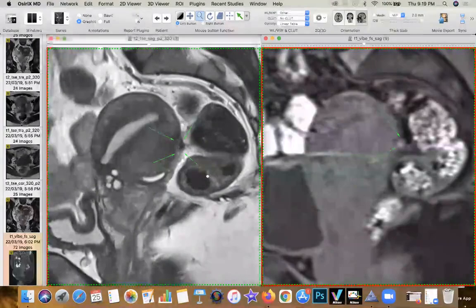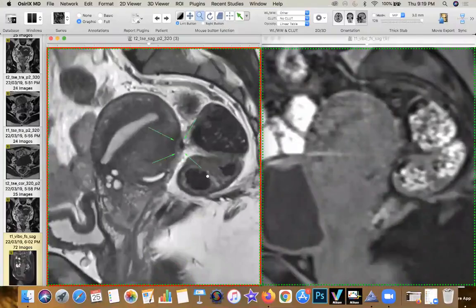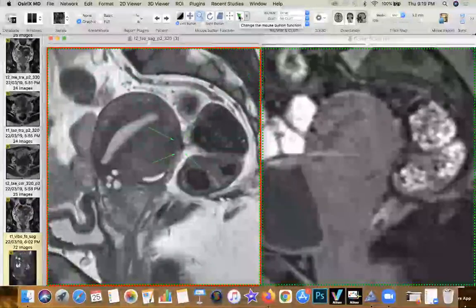Now let's see what's happening, first of all, to the corpus, and then what is happening to the surrounding structures. Now, these are important. I'm going to spend about 10 minutes on this case and then move to the other ones. So let's look at the corpus itself.